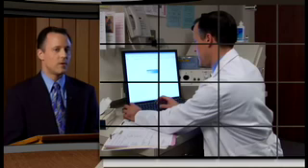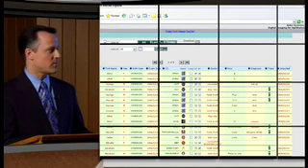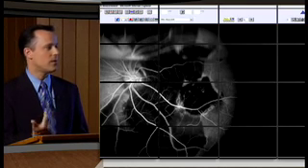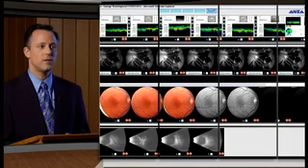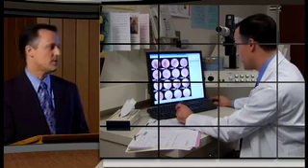So I'd like to show you some of the benefits that we found with the ANCA system within our department. First, we have easy access to patient information. When I'm in the exam room with a patient, I can simply type into the computer to a local web address, pull up their photos by name, search for all their reports, including ultrasounds, OCTs, clinical photos, and Goldmann visual fields, all within one search with a few clicks of the mouse and a few inputs on the keyboard.